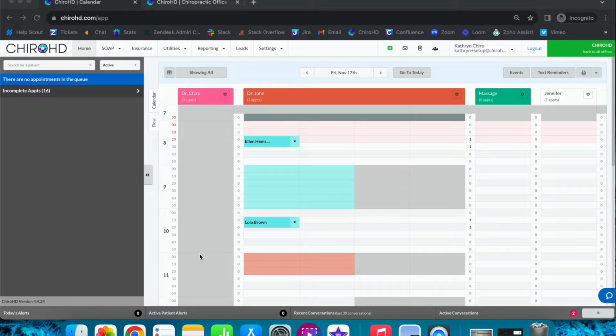Now we're going to go into how to set up your X-ray integration. We have direct integrations with Opal 2020 and Biokinemetrics. There are other possibilities that we may be able to integrate with different X-ray softwares, but we can't guarantee it. There are a few things we have to talk with you first, and you talk with your X-ray software first. So it's not a direct no, we just have to do a bit of digging.